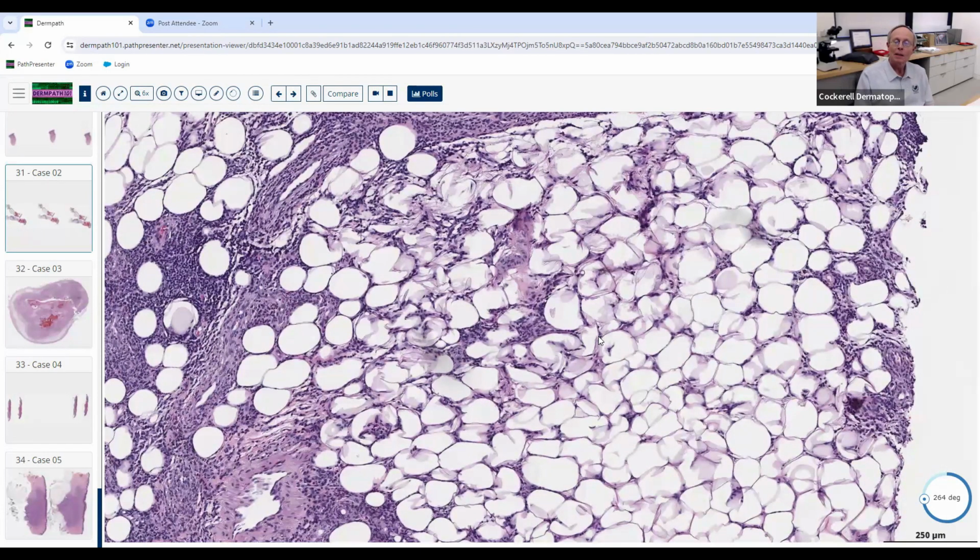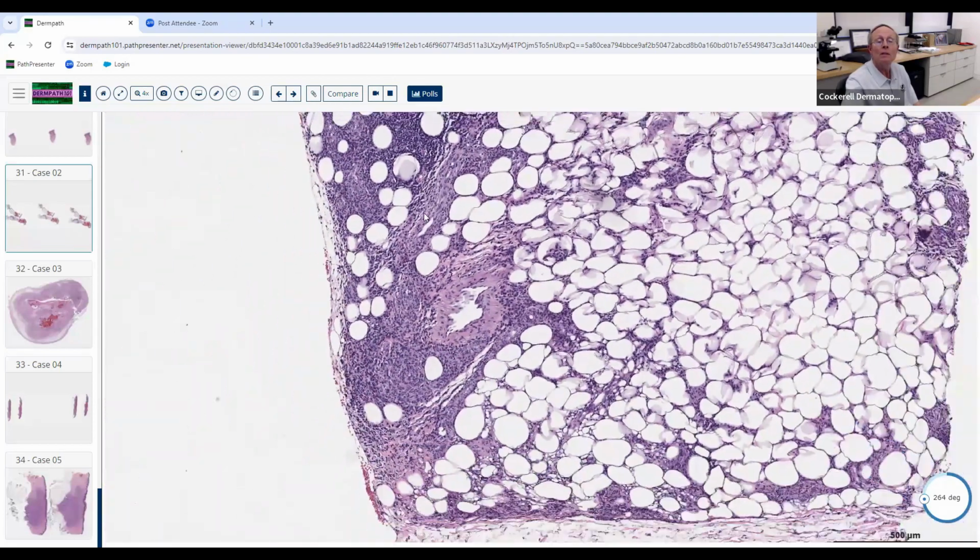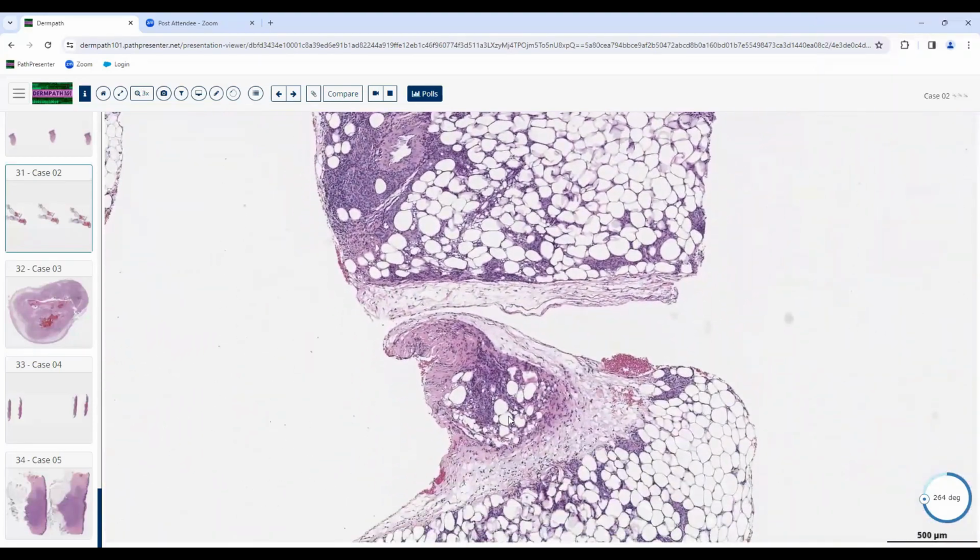You're close. I wrote in my notes vasculitis or no vasculitis. Yes, you're thinking of that. Vasculitis or no vasculitis? That's one of the next things you ask. Is there vasculitis or no vasculitis? That's important. And then you look at the type of cell. Do you think there's any vasculitis here? It looks like there is.